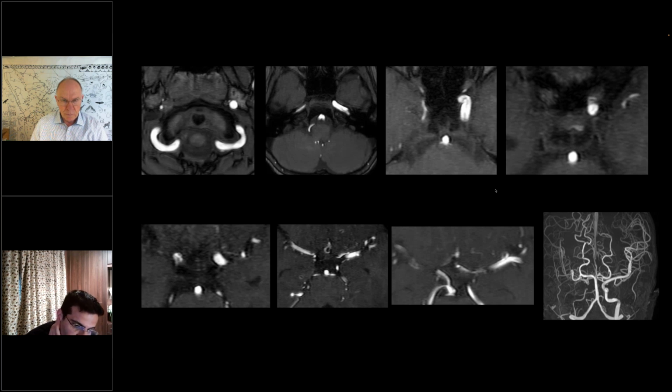I have one question for all of you. When Moya Moya starts in the early period, you might not see many collaterals, but this doesn't look like a typical Moya Moya either, right? In terms of the vasculopathy. Do we call it just a transient multifocal arteriopathy due to influenza? What to label it if it doesn't progress in the further scans also? When are these entities known? I've not heard of it with influenza.